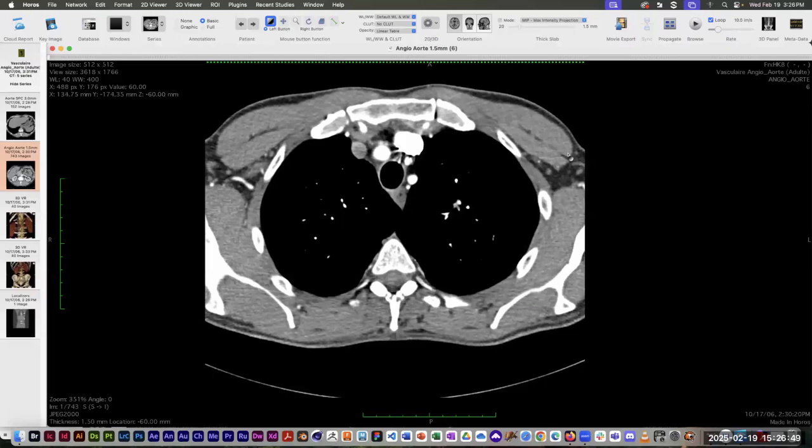So this final method of defining a region of interest and doing segmentation in Horos is incredibly fast and easy and creates really good results, but it has downsides. It only works really well when you have a structure which has very high contrast, that's very easily differentiated from the other tissues around it.